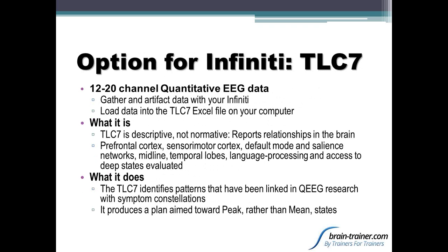The difference is that you don't need to buy another amp. You use your Infinity, you record the data with your Infinity, you artifact the data with your Infinity, and then you simply load it into the Excel file called TLC7, and I'll show you how that works on your computer. This is something that takes a matter of minutes, literally, after you've gathered the data.